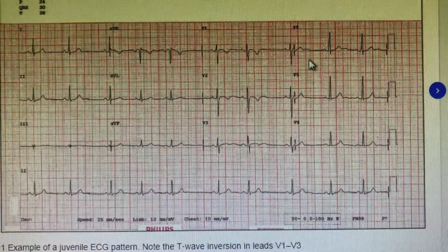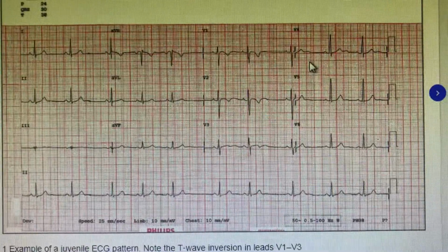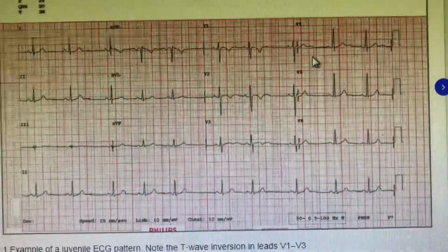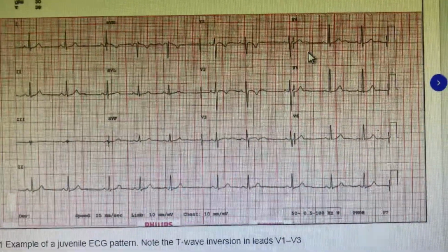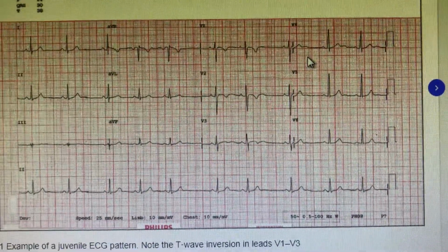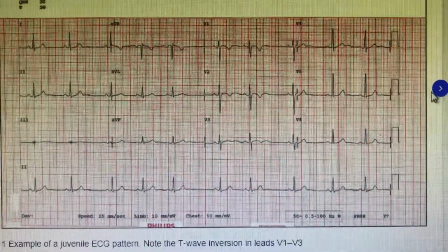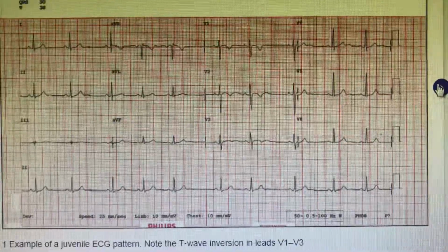And now when the ischemic episodes are there, the T wave inversions will go off in Wellens syndrome. But these T wave inversions in the juvenile pattern will be there even during stress, during the TMT, and no changes will be seen in the T wave inversions. But to be frank, it's a little difficult to differentiate between the juvenile pattern and Wellens syndrome absolutely only on the ECG.